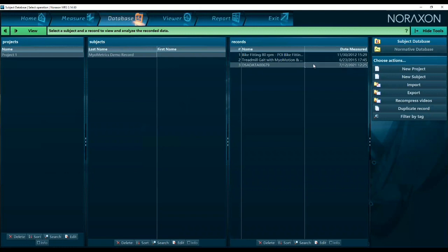So let's just act like this isn't there. I've already run this data report just to make sure that we got the output that we were looking for, but just pretend like I said that this is not here. So essentially what you'll do is you'll go to import.